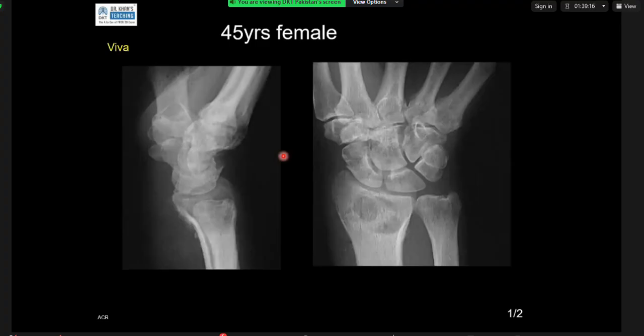So, an aggressive bone lesion in a 45-year-old female patient, I would again think of infection as one possibility. Another possibility would be a metastatic lesion. I would inform this finding to the referring clinician and discuss the case in the orthopedic meeting. Anything else in your differential?